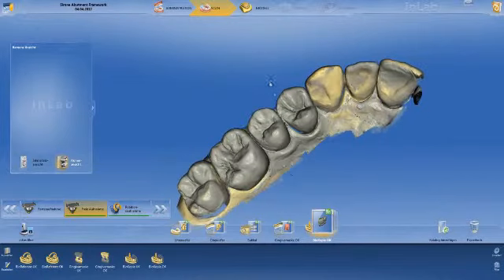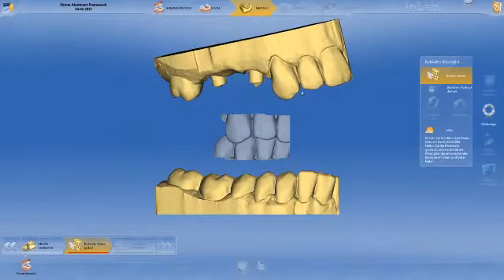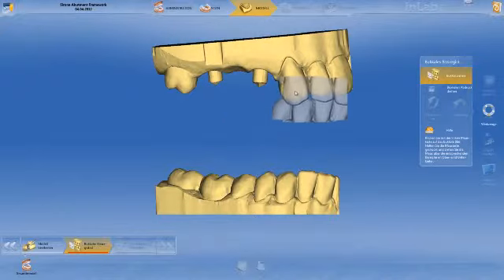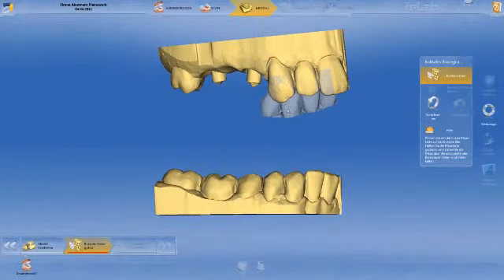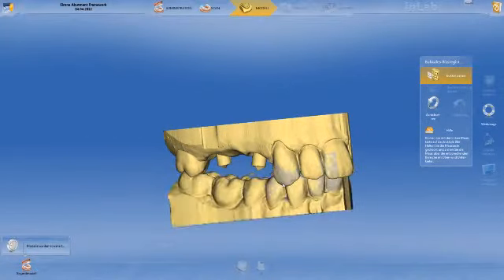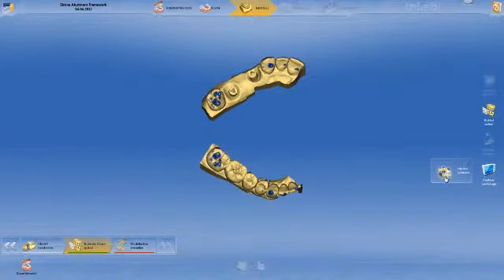When the scan is complete, I click on Model. The next step is buccal registration. For this, I move the buccal scan to the respective jaw using drag and drop. The software correlates the image automatically. In the following stage, I check the model contacts. Good contacts, both distally and mesially.